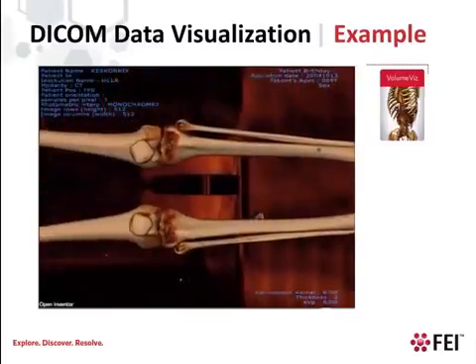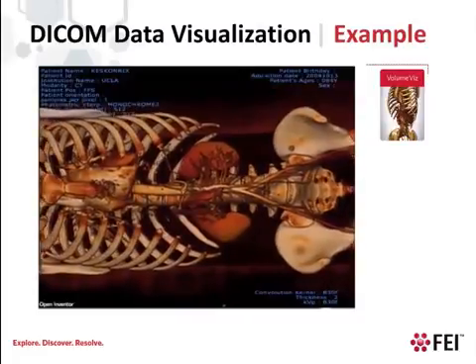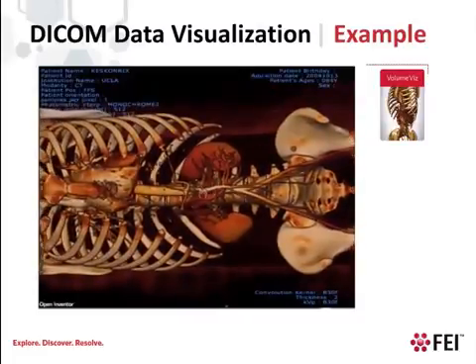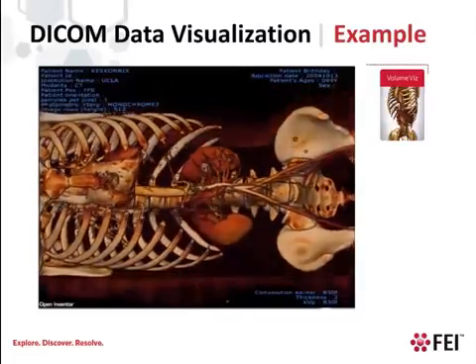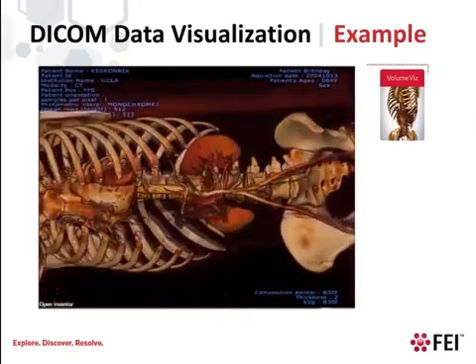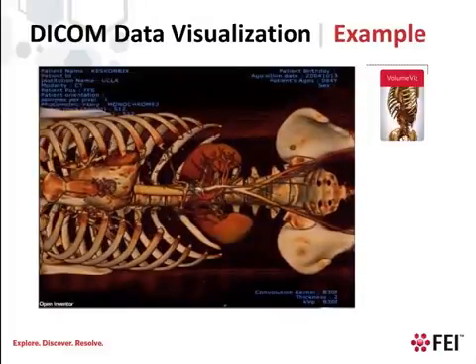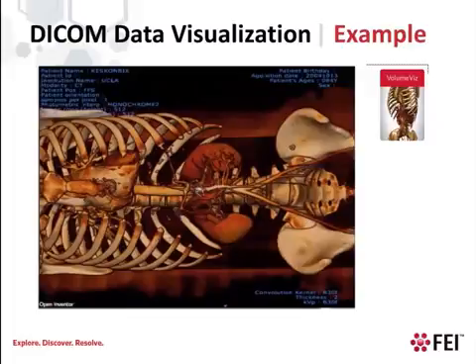then pan across to a more interesting part. We can also interactively rotate the view. Notice that the rendering quality automatically changes when we begin moving the camera. This is one of the features that allows us to maintain interactivity even for large data and high-quality rendering.